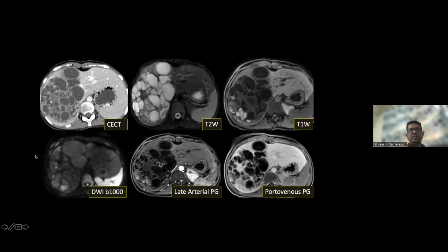Again, MRI, if you see here, one may call it a hydatid cyst. No, it is not a hydatid cyst because there are enhancing septae and there are solid areas which are also enhancing. So in hydatid cyst, the septae will never enhance. Just remember that.